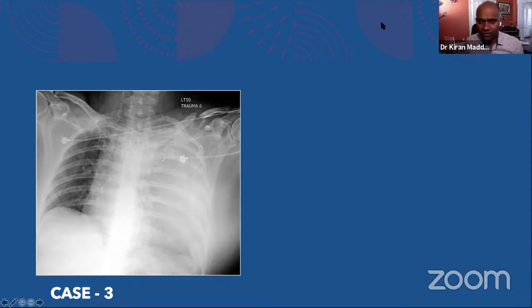Very good. I got some answers there. Total opacification, says Salim, and then lung collapse. If the lung collapses, it drags the mediastinum towards it rather than pushing it to the opposite side. Very good, thanks for answering. I'm not going to be picky here. I'm going to tell you the findings. The findings are, you see a lung parenchyma on the right side and entire opacification.